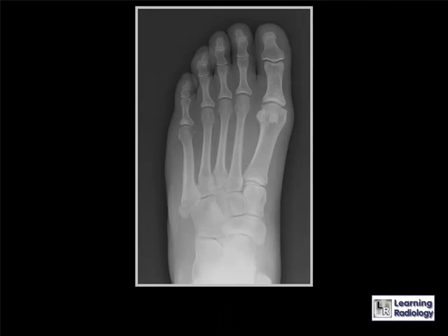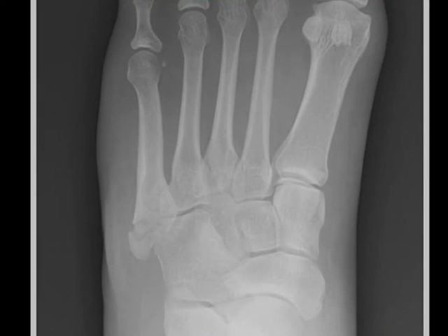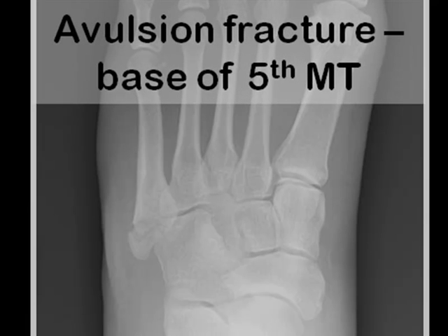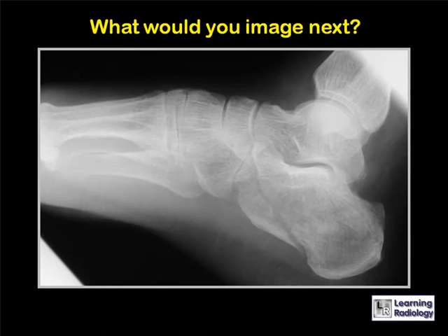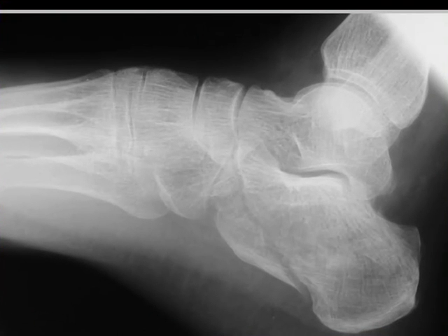Here's a second case. Pause your computer or MP3 player. This patient has an avulsion fracture of the base of the fifth metatarsal. Here's your next case. What would you image next? Pause your computer or MP3 player.